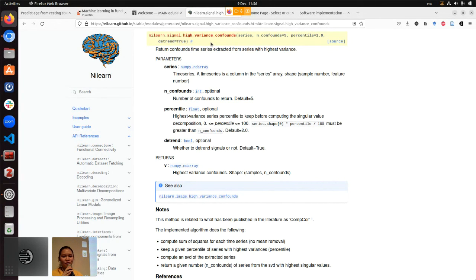So just for the online crowd, this function is very useful for a case where you only have the data, but you don't have the confound file coming with your data. And this is definitely a valid scenario that you can encounter when you're working with data that is in the wild internet. You just found some data, and all it says is processed, and there's nothing extra with it. Then this kind of function will become very handy. That's a great question. Thank you.